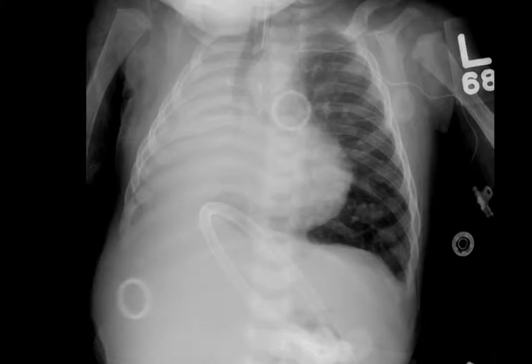This is a patient with complete collapse of the right lung. Even though he's intubated, they can still develop mucus plugs. You can see there's tremendous mediastinal shift to the right despite the rotation to the right. There's no real reason to implicate a pleural effusion here, especially if there was never a central line on that side. He's had cardiac surgery. That's what these clips are from, and a previous right thoracotomy as well. The right thoracotomy, additionally, was because he happened to have esophageal atresia, and that was repaired, and then his tetralogy of Fallot was repaired after that.